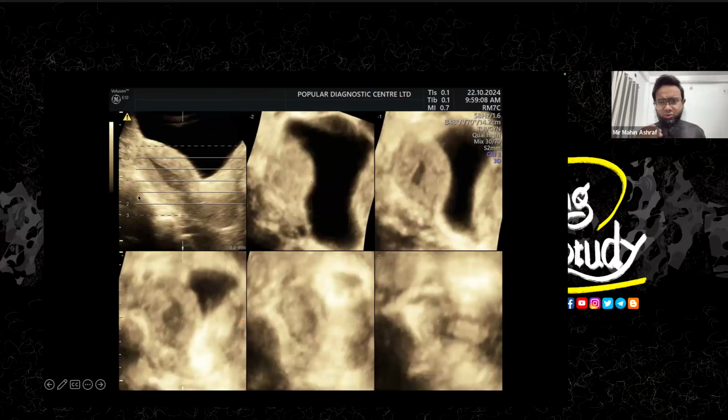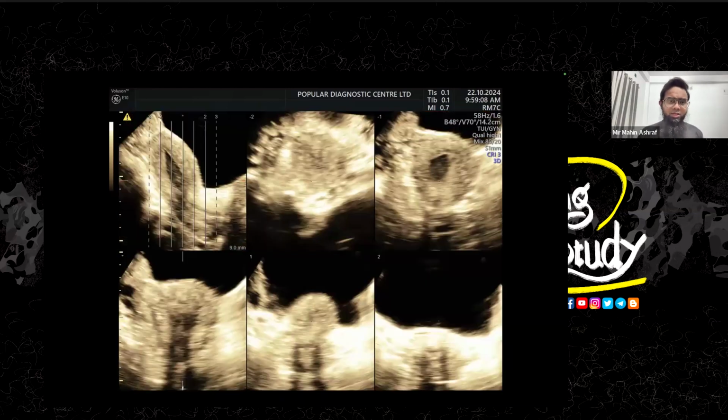So we just chose another section from sagittal. We took the slice, and we can see now some coronal sections here. Not very good, but it's usable. So here we took the sagittal section and choose the area we want to see, and the axial cut. So these are the axial sections.